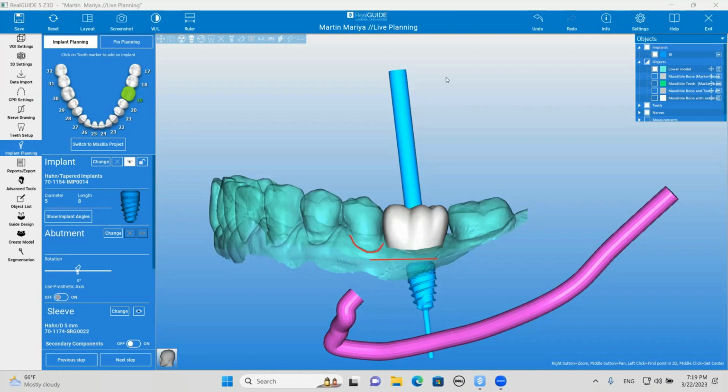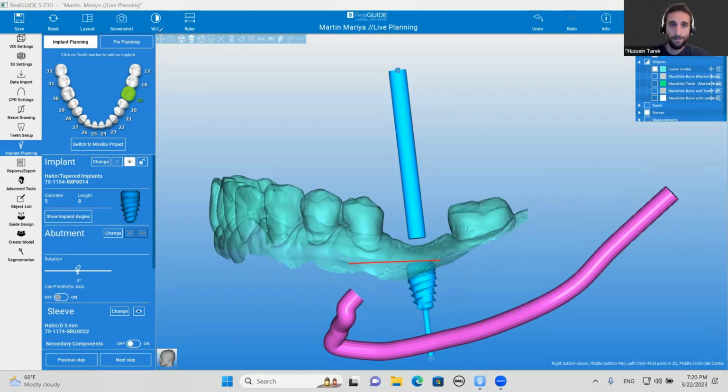Okay, so Scott, let me show you a couple other things. Hussein, can you get rid of that tooth? Oh, yeah, absolutely, sir. So let's take the tooth out. If you look at this, let's look at it on the pan view real quick. Yes, sir.